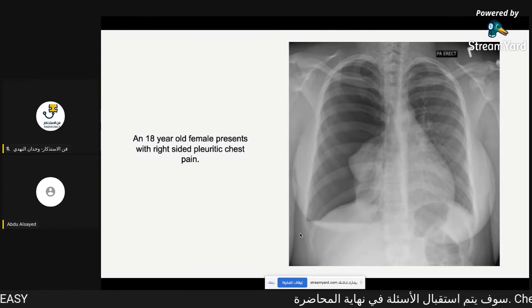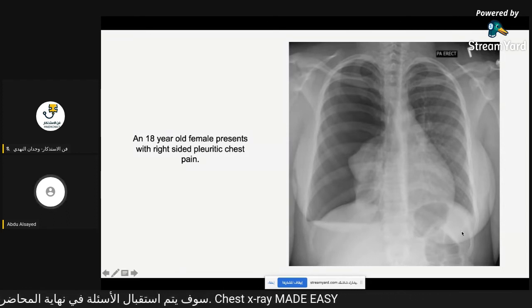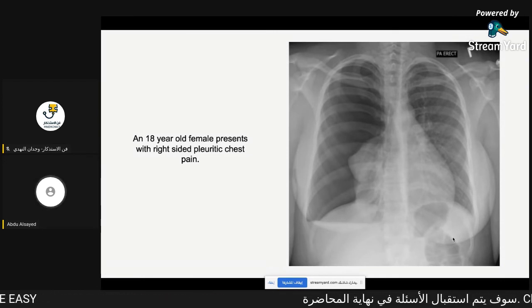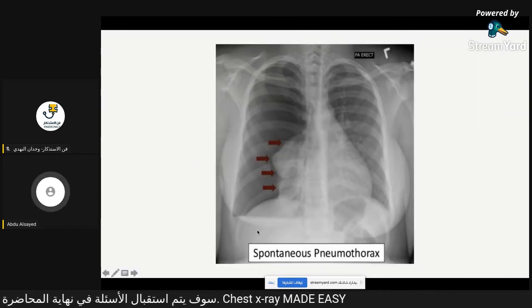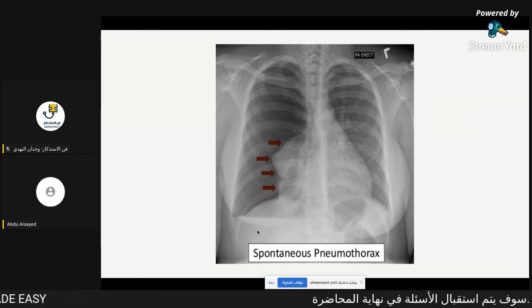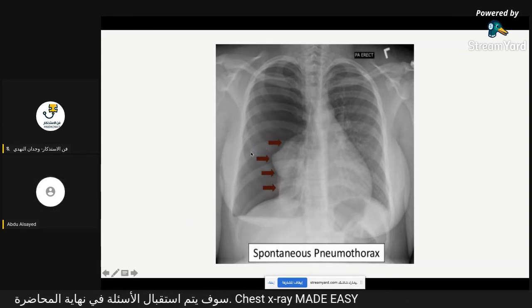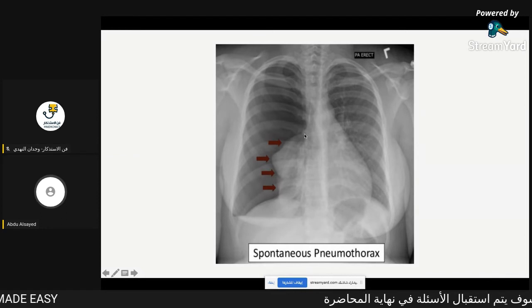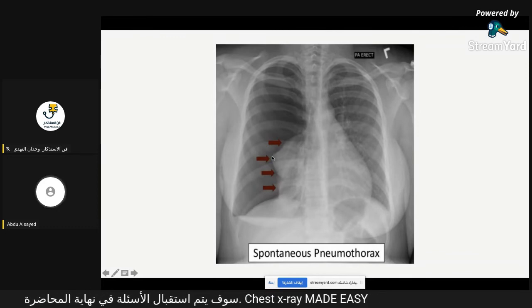How can we discover the pneumothorax, either traumatic or spontaneous pneumothorax? The interstitial tissue, what we have here, does not appear well on the right side. We can evaluate this is the lateral border of the lung, which is a right lung. It's totally shrunken or collapsed. Loss of interstitial tissue in one area is pneumothorax until proven otherwise, or a collapsed area until proven otherwise.